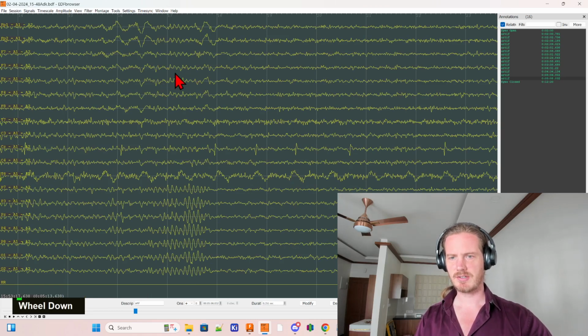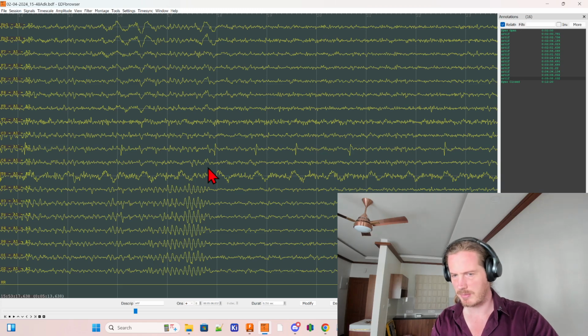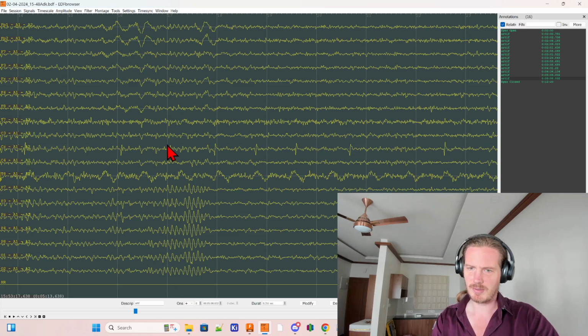And here, this is interesting. So we can see there's an eye blink here. It's very slight. You know, the person is slowly blinking their eyes. And then at the same time, underneath here in the occipital, this is the back of the head, we see these strong alpha waves. Because the moment this person closes their eyes, even if it's just for a slow eye blink, we're getting these alpha waves in the back because the visual cortex briefly is not processing any information.